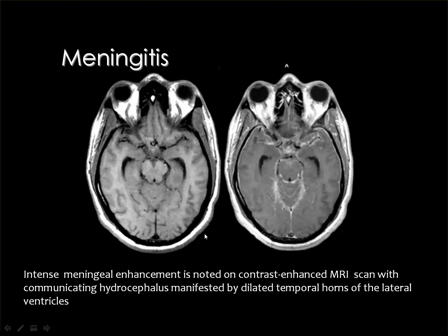And this is an example. In the pre-contrast study, you see distension of the temporal horns, meaning that the ventricles are dilated. After injection of contrast, you see enhancement of the basal cisterns, enhancement of the quadrigeminal cistern, the tentorial leaflets, and the cerebellar folia. Enhancement of the CSF spaces means that the inflamed meninges here are the leptomeninges. Leptomeninges are the arachnoid and the pia mater.